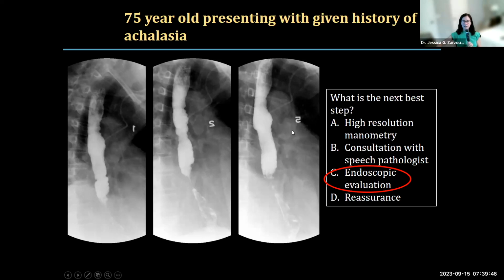But in this case, the esophagus isn't that dilated. There certainly is, the esophagus is not emptying normally. We have a fluid level here in the upper esophagus, and we timed these images at 1, 2, and 5 minutes the way that we characterize achalasia.